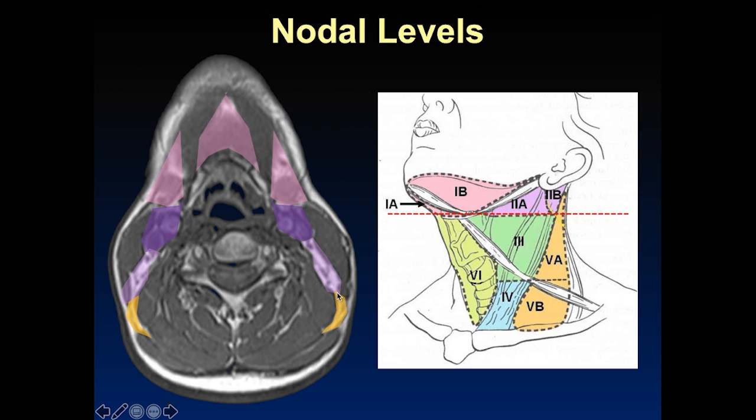portion, and what delineates it anteriorly is going to be the posterior margin of the sternocleidomastoid muscle, shown here, and behind that area you're going to be outlined by the anterior margin of the trapezius right here. So these are your posterior cervical triangle or level 5 lymph nodes.